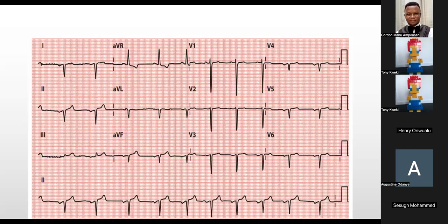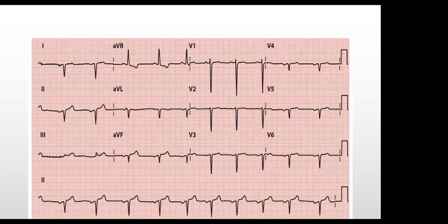And so I just wanted to look at this. What do you think is the ECG we're looking at? Like I said, it's going to be an interaction. Of course, I won't be discussing ECG from the beginning, just to flag some things for us to be able to remember some of the ECG we've already seen before. So I'd like someone to make an attempt to look at the ECG we have on the slide. What do you think this ECG is?